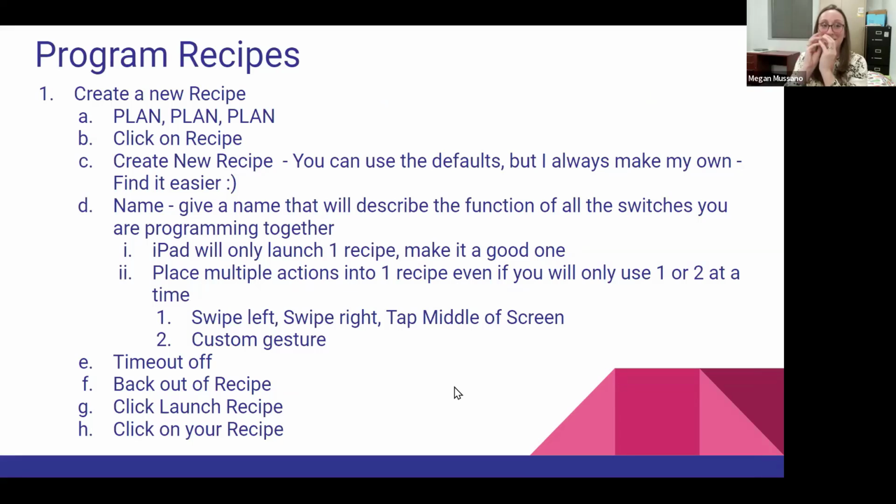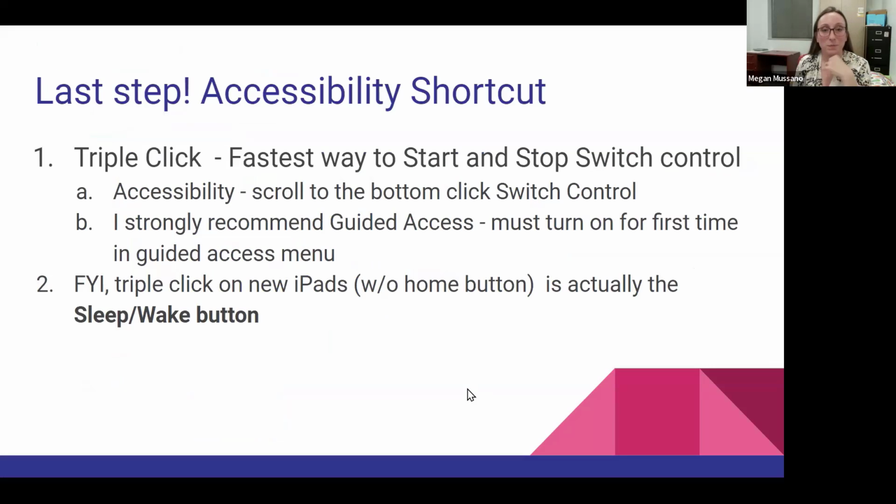And then we can do the fun stuff. We can create the recipes. So plan what you want. Like initially I showed the swipe left, right, and tap middle of the screen, but you can give a million others. So these are the directions based upon the video I just showed you of how to program the tap middle screen, left, right swipe. That's just the written out directions.